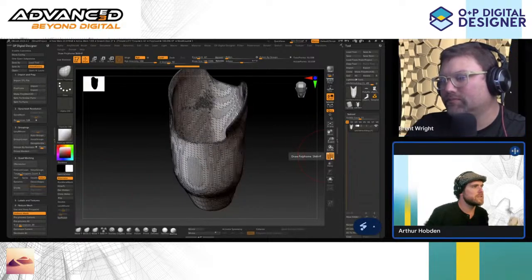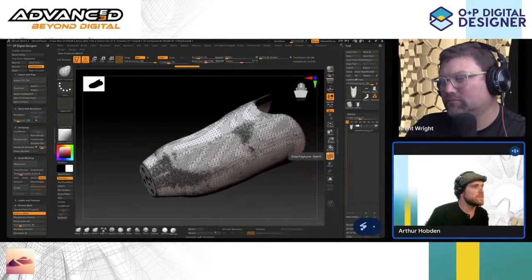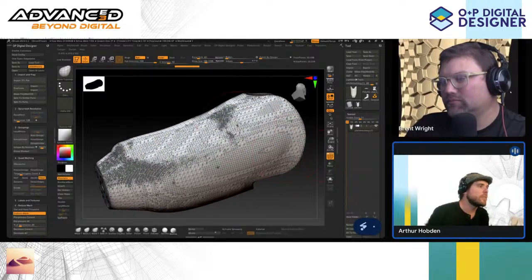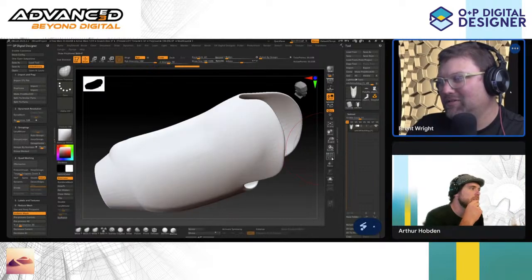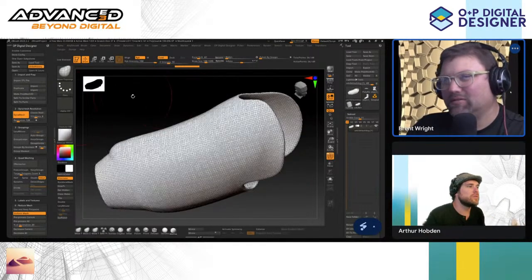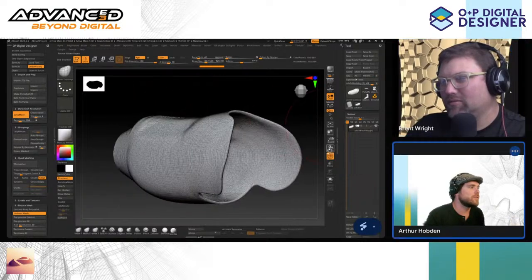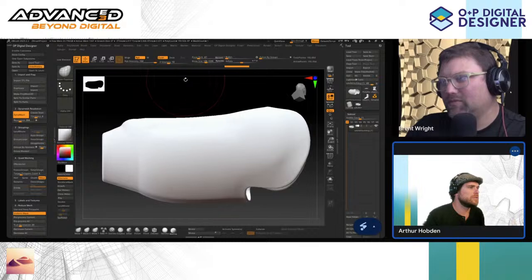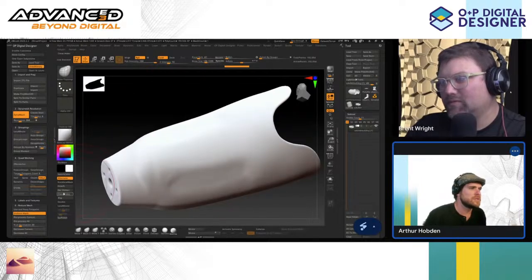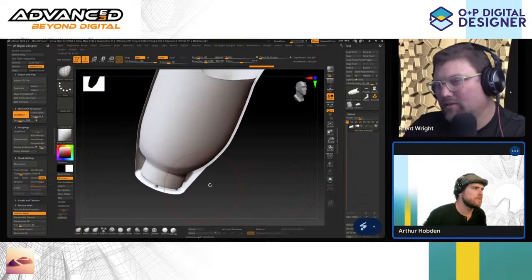Okay, gotcha. Yeah, the remeshing has some, that's very interesting, the topology. I might remesh this just for fun. Yeah, do it. Let's just see it. Something like that, just to help smooth it out. Polish. Oh. Yeah, I like all the rounded corners.